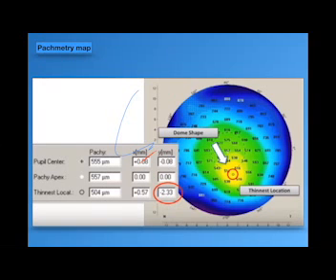And I'm sure that you will find abnormality in the curvature map of this patient, and if you get the corneal hysteresis of this patient, you will find it below normal. Also, the color scale of this pachymetry map is dome shaped. This dome-shaped pachymetry map is a suspicious figure. Before studying the numbers, you may suspect this patient from this shape first.